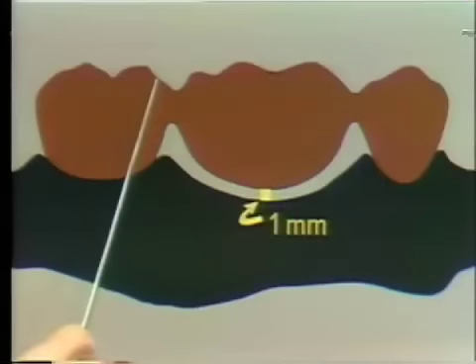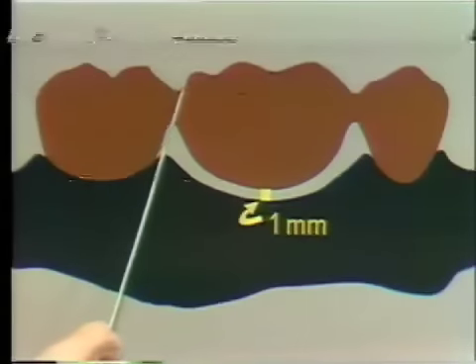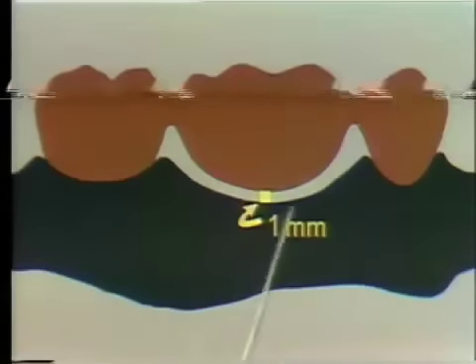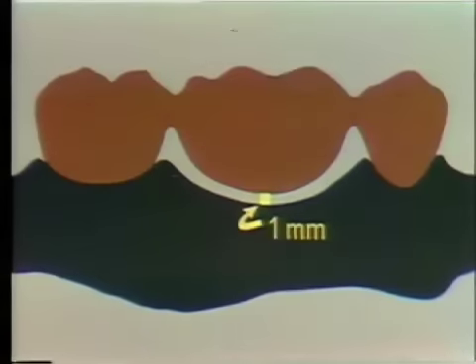Marginal ridge of the molar behind dropping down to the contact point, rising again in this area. Important thing to develop in these Pontics: the occlusal embrasures here and here, the opened interproximal embrasure here, and the spacing from the alveolar tissue of 1 millimeter through there.